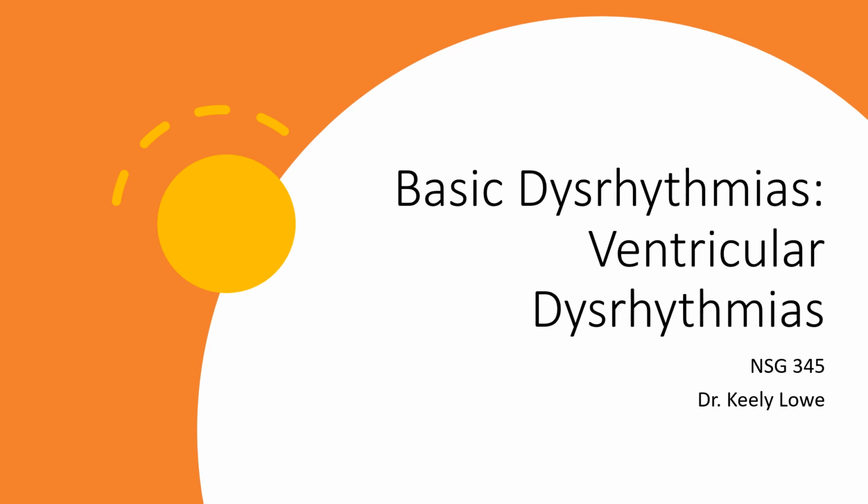Welcome to this video, basic dysrhythmias, ventricular dysrhythmias. We're going to go ahead and get started looking at some ventricular dysrhythmias. Remember, ventricular meaning we're looking at the QRS complex.